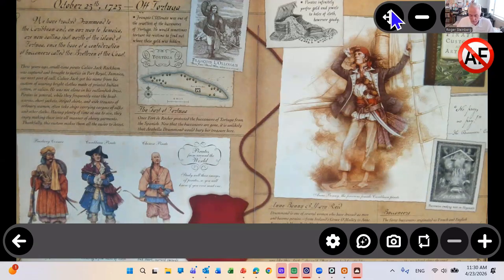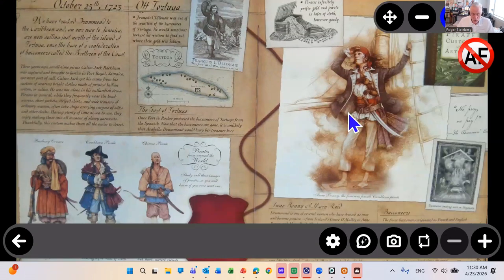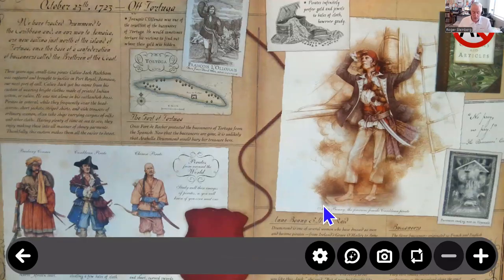So this is why we chose to have a 4-sided arrow as that 4th icon there that you can use to click and drag this window around. Let's say that you get working with the software and you don't want to have this screen real estate taken up and you don't need to see your taskbar right now. Rather than going to settings, one of the features of the Windows interface mode is that you can use the key shortcut Alt-W, which will take you out of the Windows mode, and you'll see that my screen just refreshed itself. Those items are gone from this screen, and I'm left with just my magnifier. My taskbar is gone and so forth.